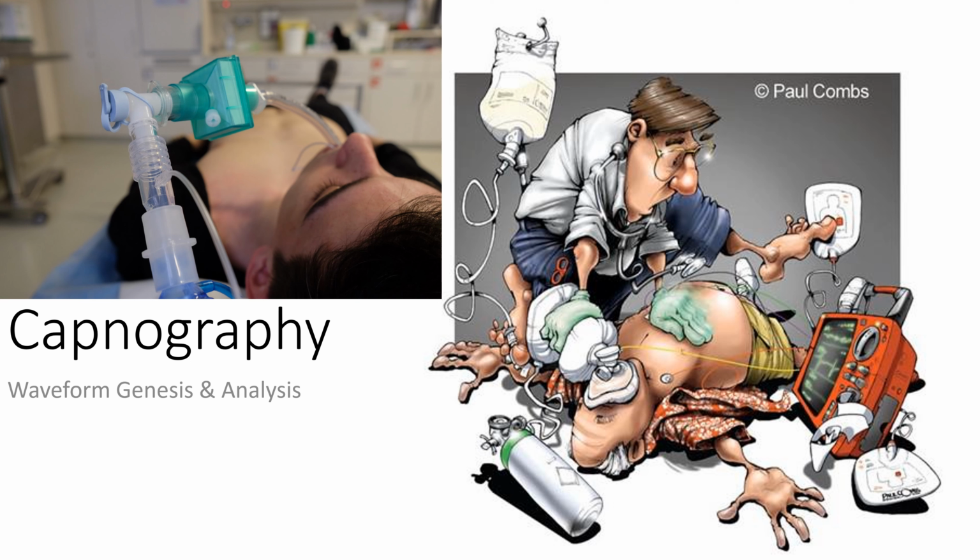Okay. All right. So capnography is the measurement of CO2 being exhaled, right? So it's end tidal CO2. A patient produces CO2 in the lungs, and that's going to be exhaled, right? And we can pick that up on the monitor right here, with a little side stream adapter here. We can pick it up on the monitor and get our end tidal CO2. So the patient produces CO2 in their lungs, they exhale it, and then we can pick it up right here and get our capnography.